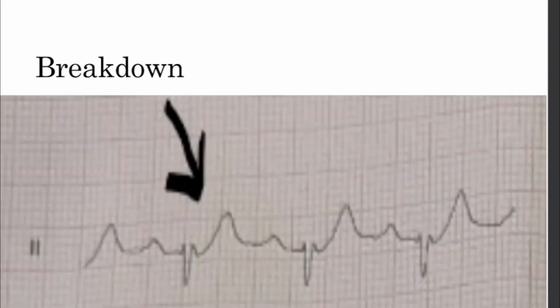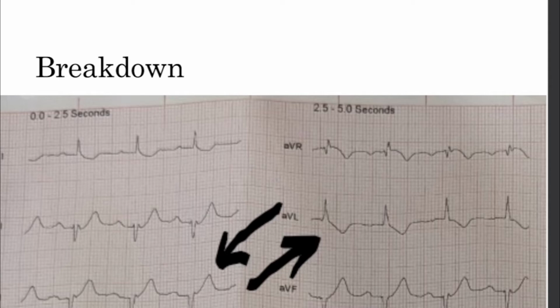Note that in lead 2, you could fit the entire QRS complex into the T wave, and the T wave in aVL is inverted and possibly showing a reciprocal change. Always remember that the most reciprocal leads on a 12 lead are leads 3 and aVL. These leads are essentially mirrors of each other. At any point, if you see an inverted T wave or ST segment depression in aVL, you should scrutinize the heck out of lead 3 for evidence of ST segment elevation or T wave changes.